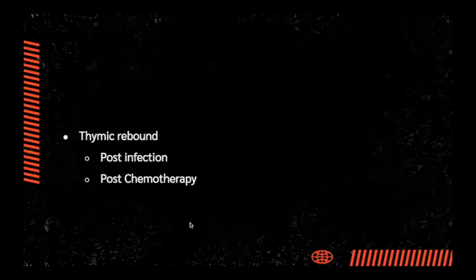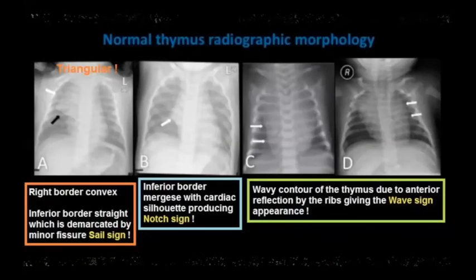To make things worse, there's a condition which is thymic hyperplasia or rebound, seen post-infection or post-chemotherapy. This will cause further dilemma for us to say whether there is a mediastinal mass or a normal thymus. So again, this is the appearance of a normal thymus on radiograph.